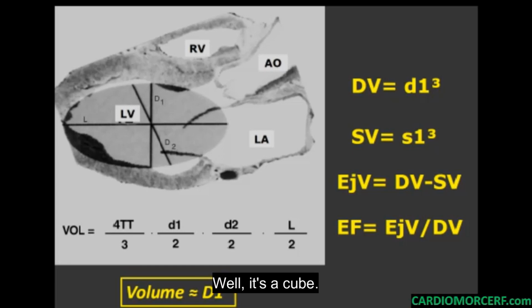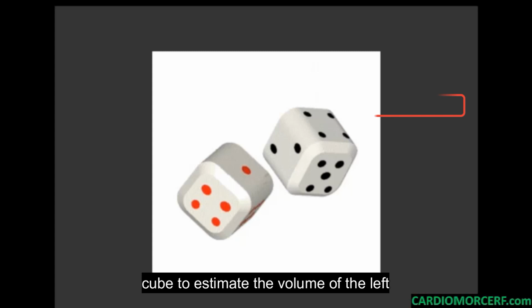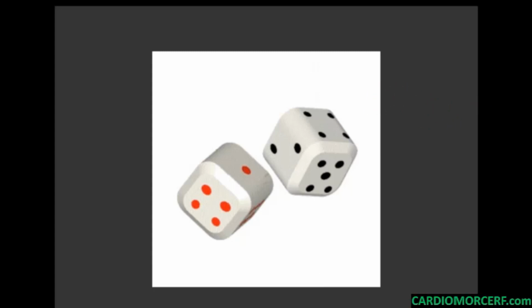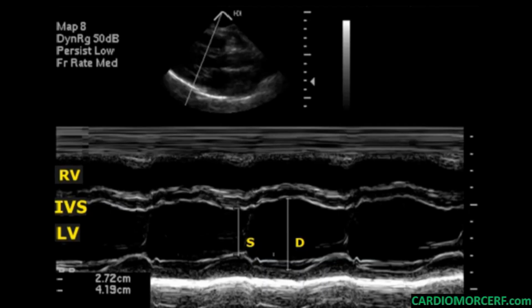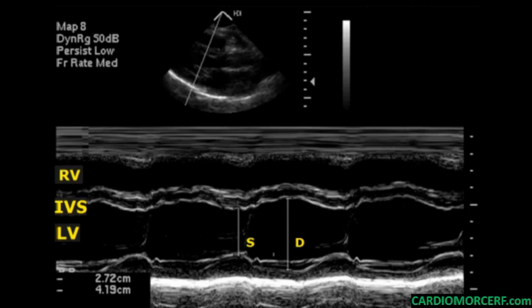Well, it's a cube. Goodness, we are using the same geometric equation to evaluate the volume of the cube to estimate the volume of the left ventricle. It stands to reason that for sure it may not be accurate. To believe that we are going to obtain with only a diameter the volume and the ejection fraction of the left ventricle is a fantasy.